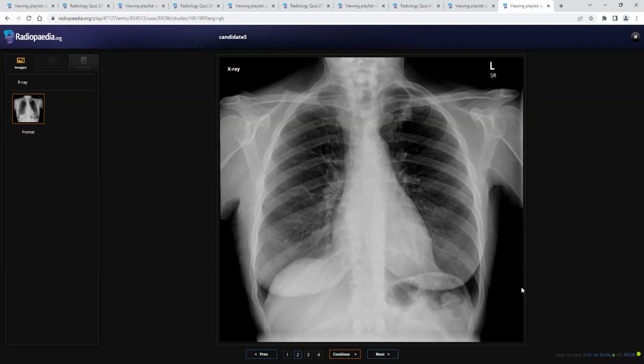Okay, so what are your review areas on chest X-ray? I would like to look at the apices, the retrocardiac area, below the diaphragm, the hila. I cannot appreciate any retrocardiac opacity. There is a slight bulge on the right paravertebral region. However, that is possibly projected. Okay. However, clinicians suspected some abnormality and they proceeded with a CT further.